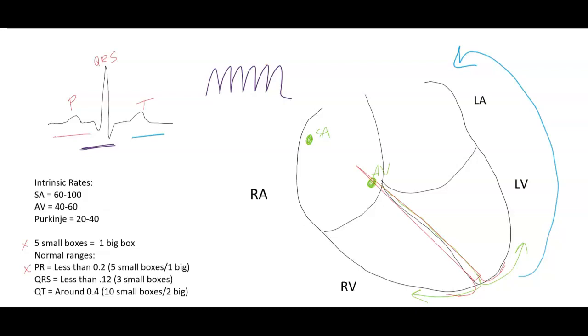And in this case, same thing. These are just responding crazy. There's a crazy little party here. They're going too fast. And therefore, we know there's a ventricular issue with that.